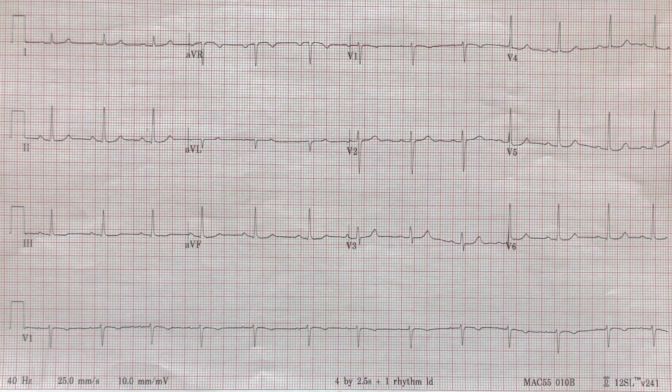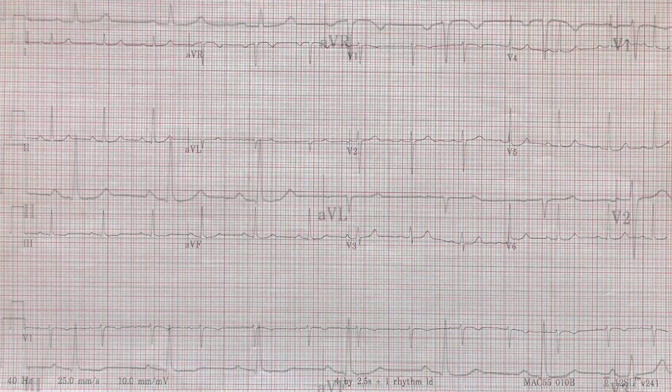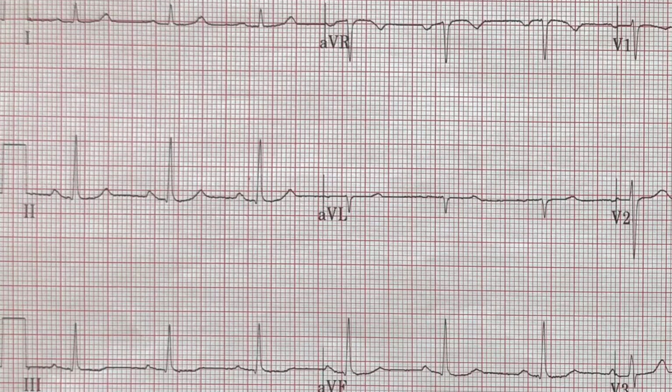This is an example EKG. This patient presented to the emergency department with chest pain. And so, of course, with every chest pain, we want to rule out a myocardial infarction, or heart attack, with an EKG. All of the waves that we talked about are clearly visible.